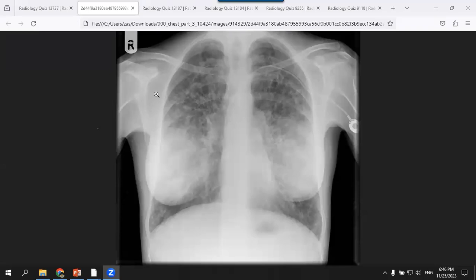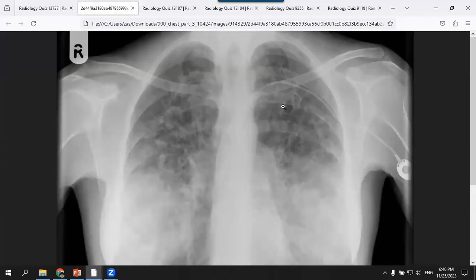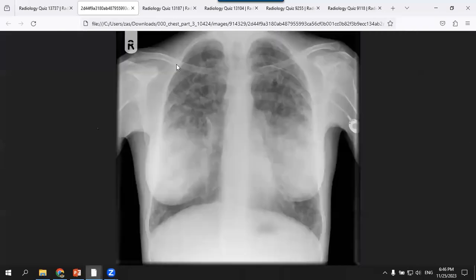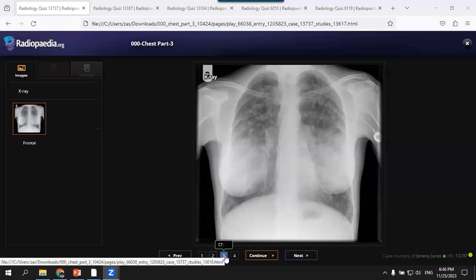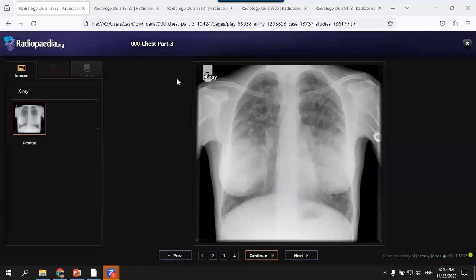So these patients have bilateral, mainly upper tramline changes, suggestive of bronchiectasis. Good. If I told you young patient, okay, it's cystic fibrosis. It's a classic cystic fibrosis. So why I was faking? I was heading to the diagnosis.